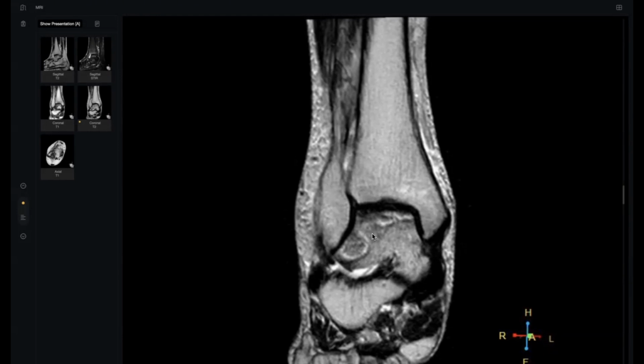The bone infarction is intramedullary rather than subcortical. Excellent. Stop here. This is the point. This is the answer. The bone infarction is within the bone marrow, but the avascular necrosis is subcortical. Okay. Some textbooks said that avascular necrosis starts at the beginning as insufficiency fracture, and then proceeds to avascular necrosis.